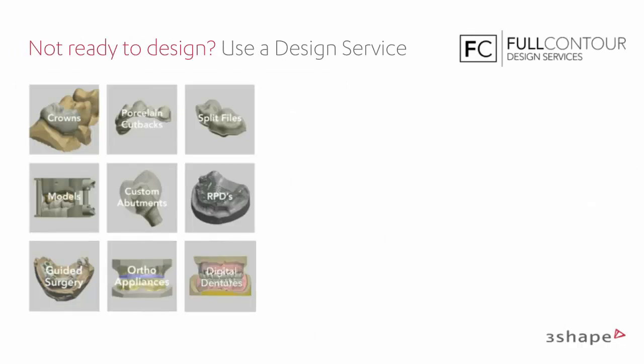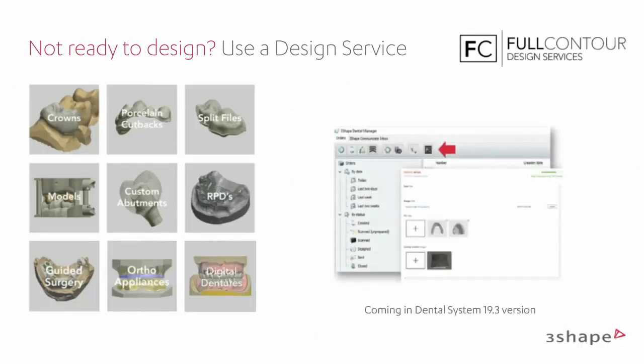Also, if you're not ready to design, you can use a design service like Full Contour, which has a lot of experience now in designing dentures. In the newest version, 19.3 of Dental System, there's also a full integration up here. I can basically click the Full Contour button. It's not rolled out in all countries yet, but it will be. And you can send your case directly to Full Contour. So really nice, and a good alternative, also as an overflow service.